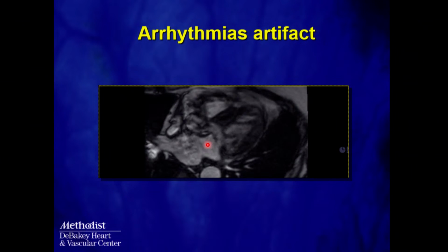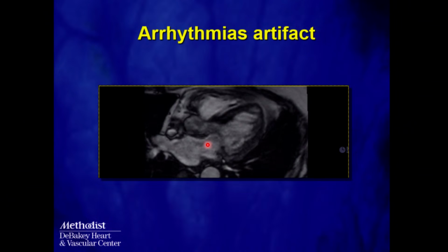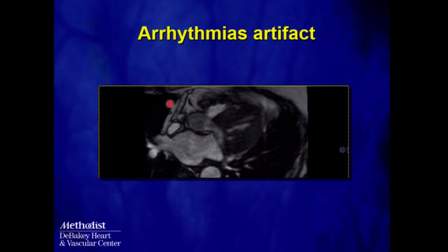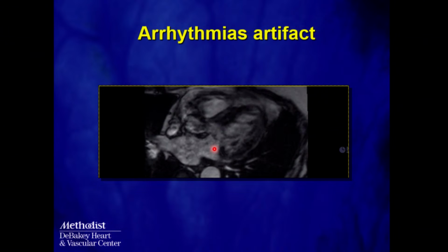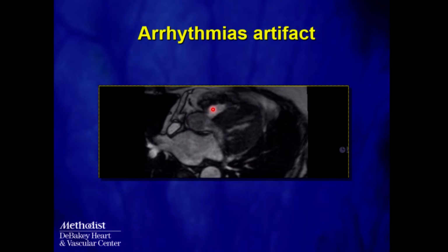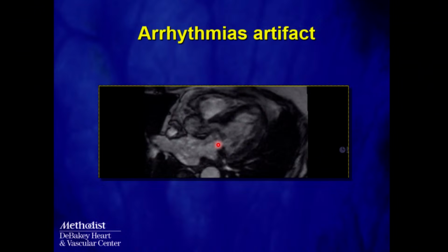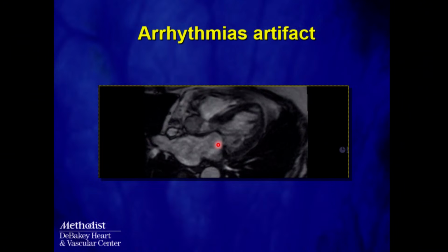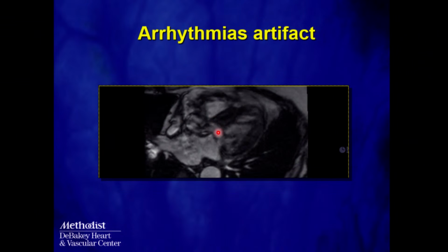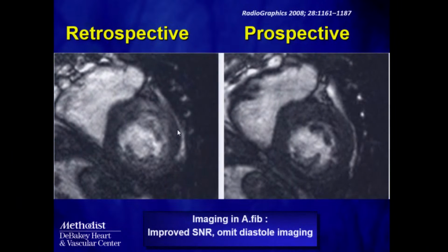When someone is having AFib with RVR or a lot of PVCs, so anytime you have a heart rhythm abnormality, it's going to affect the entire image acquisition. So this is a 5-chamber view where you can see the aorta, the RV, the LV, and the LA. But I hope you agree with me that this image is suboptimal because there is a lot of artifact. Notice how this is arrhythmia artifact, which is affecting the quality of your image. You're not seeing the borders well.